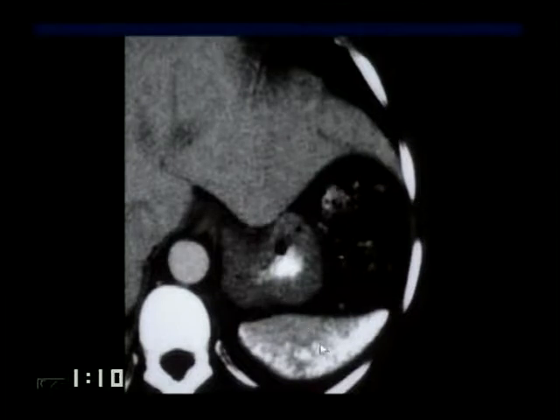And this is autoinfarction in a patient who has sickle cell disease. And sometimes we go read these cases in sickle cell disease and nobody notices that the spleen is missing because it's actually so thin and rim-like that it's confused on a quick read for a rib. And you just see it really plastered up very, very high, and almost your eye just catches it as though maybe it's a rib. But the advanced sicklers will have this autoinfarcted spleen that may ultimately calcify.